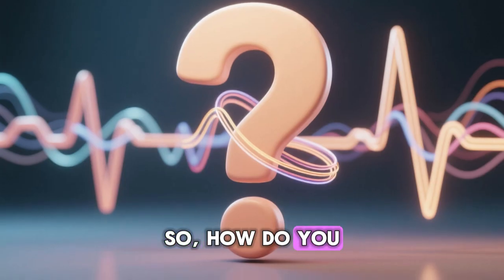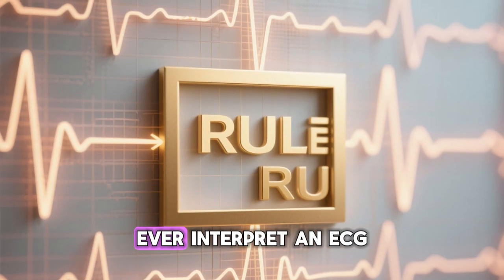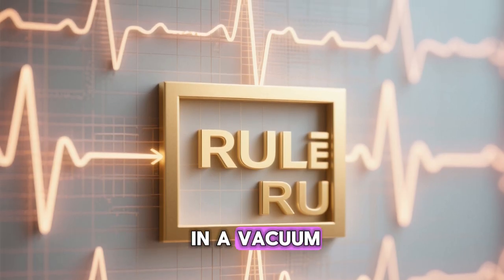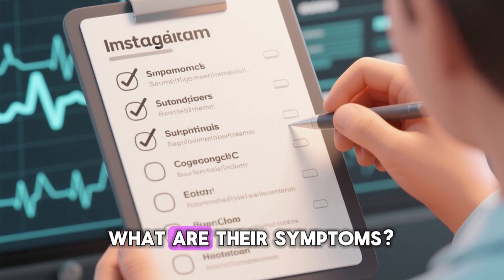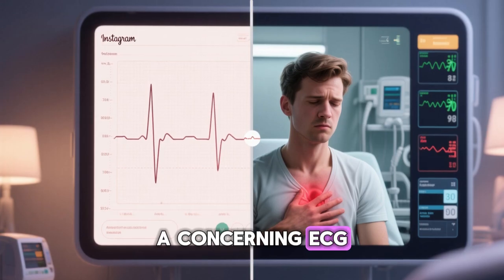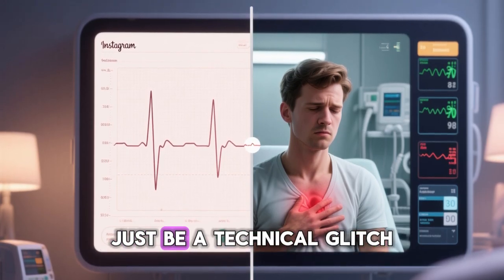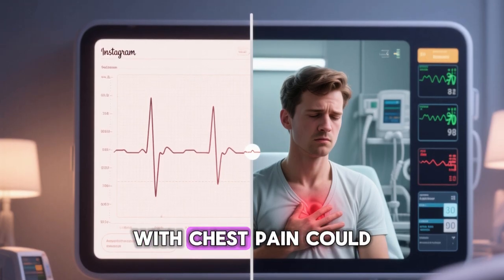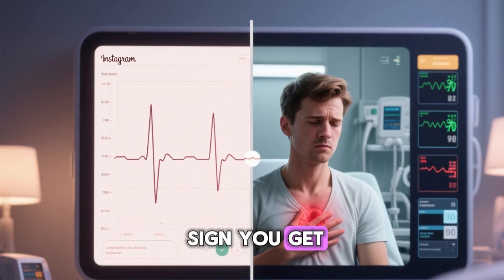So, how do you pull it all together? Here's the golden rule: never ever interpret an ECG in a vacuum. Always correlate the findings with your patient. What are their symptoms? What's their history? A concerning ECG on an asymptomatic patient might just be a technical glitch, while a subtle change in someone with chest pain could be the only warning sign you get.